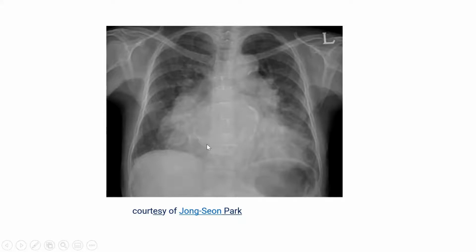Because this underscores and emphasizes the first thing we have talked about. Once you see some structure, it's very hard to precisely locate it by chest X-ray, because it might be anything in this direction, anteriorly to posteriorly. So this one here can be any structure from the sternum to the spine. Yes, it can be. But your guess is right, I wouldn't say it's wrong. But in this case, this is the left atrial calcification.